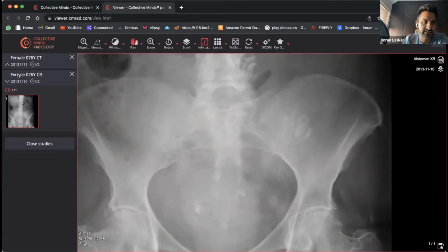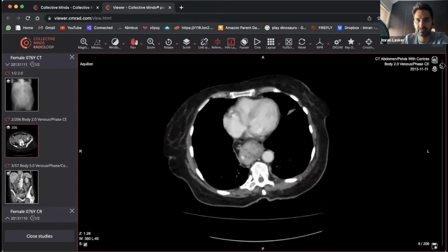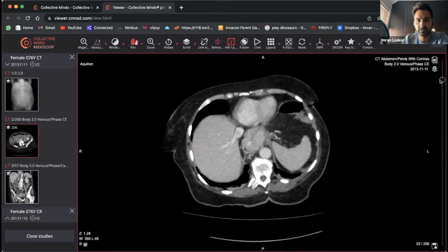So this patient didn't get any better. So they needed to end up doing something else. So as usual, you do a CT scan to try and see it. And I might have given the answer away already. But as you scroll through, we're scrolling through from the top.